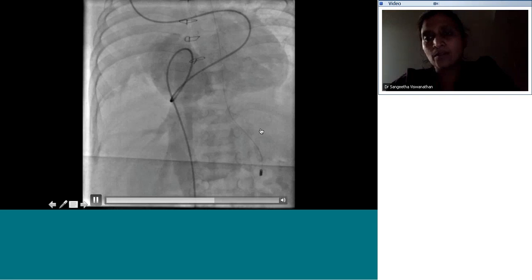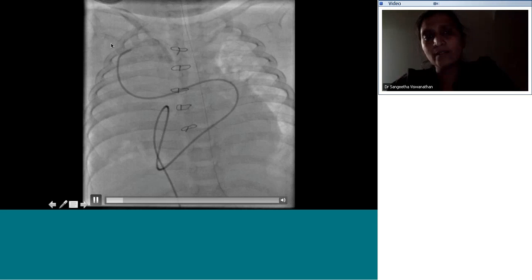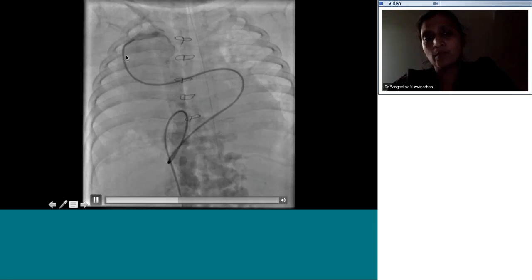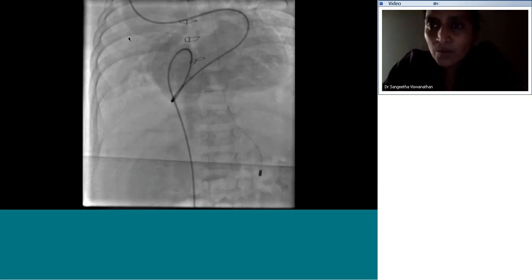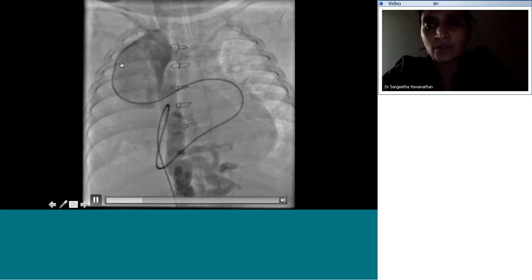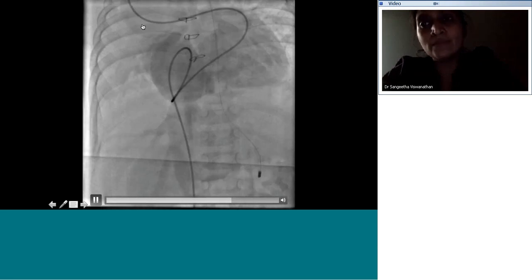Okay, Dr. Akshata is getting close to it. Up to the RPA is correct. So where is the tip of the catheter actually? The patient has had a procedure. So try and think of what procedure it could be given this catheter course. Okay, this looks like an azygous vein. Perfect. So where does the azygous usually enter?